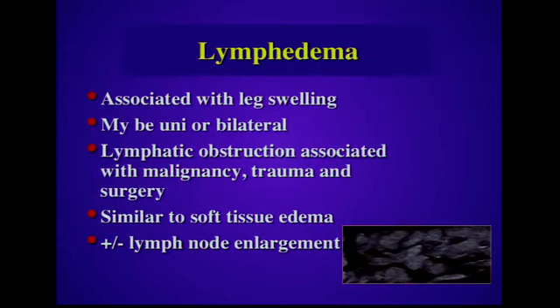Lymphedema is also associated with leg swelling, and this can also be unilateral or bilateral. Lymphatic obstruction, which produces the fluid that we see in the tissues, is associated with malignancy, trauma, and prior surgery. The appearance is very similar to what you'd see with soft tissue edema. One difference may be that you may have concomitant lymph node enlargement.